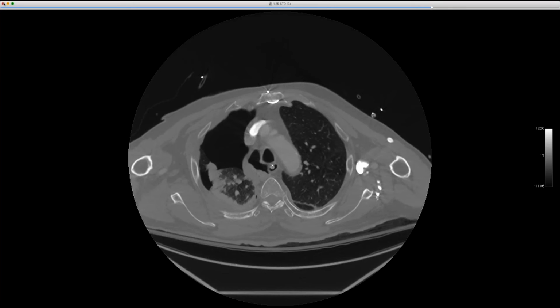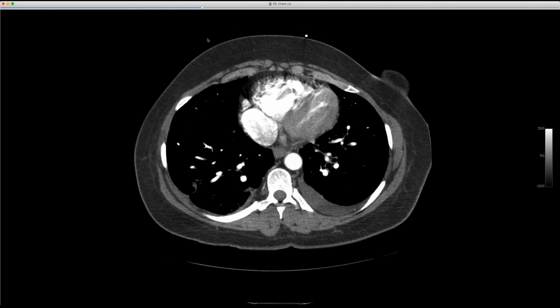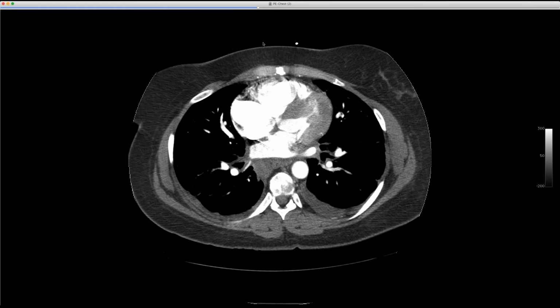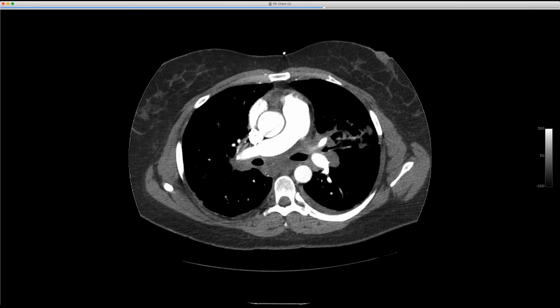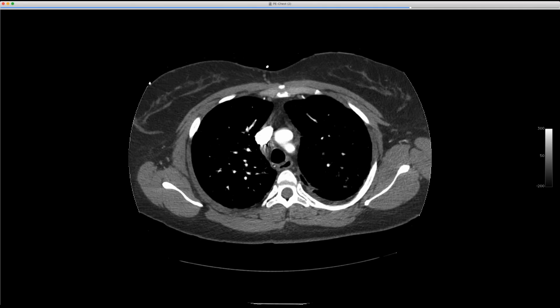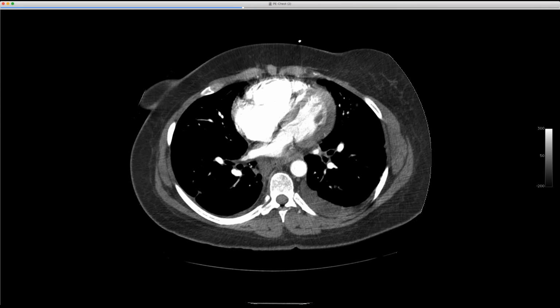Yes. Now here's my sarcoid case for you, David. Let's share it. This is 2013, and you can see the pleural effusion, thickening, and extremely tight pulmonary veins, lymphadenopathy, all the way up. So good picture for sarcoid. But you see the pulmonary vein stenosis, right?